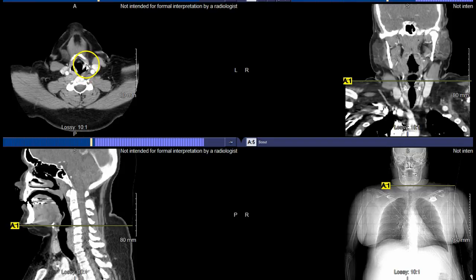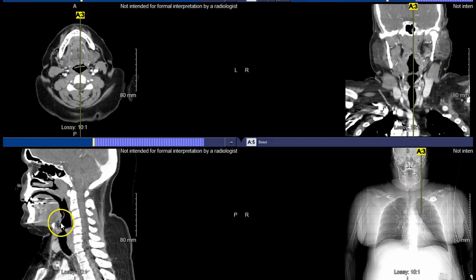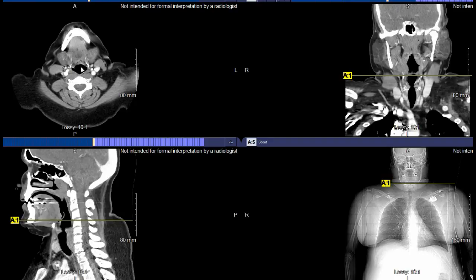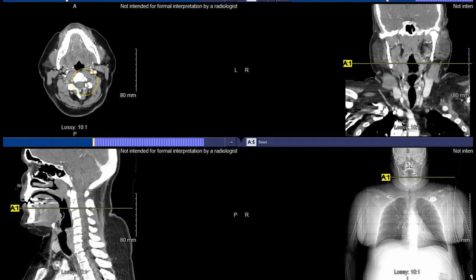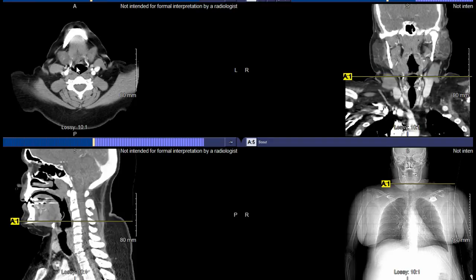And then subsequently we have the piriform sinus. They're pretty well visualized here, and you can see where we're at on the sagittal image additionally. Obviously we can see where the epiglottis is pretty clearly on this particular image, so see how that correlates with where we're actually at. Okay, we should not be visualizing the epiglottis anymore, and in essence we're not. We can see it very clearly here, here, and here, and that correlates on the sagittal-based images. Hopefully you're seeing these transitional phases as we go through the scan itself.